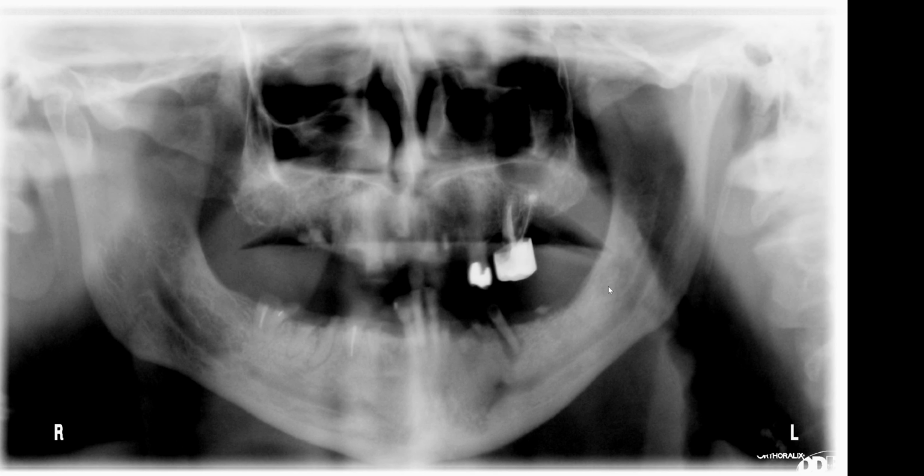Again, we can see that for the most part, the tooth-bearing area of the mandible is markedly sclerotic. And if you recall from my class, you know that it's due to persistent, long-standing, chronic inflammation, right? So this inflammation is what's causing the trabecular bone to be highly dense and sclerotic.